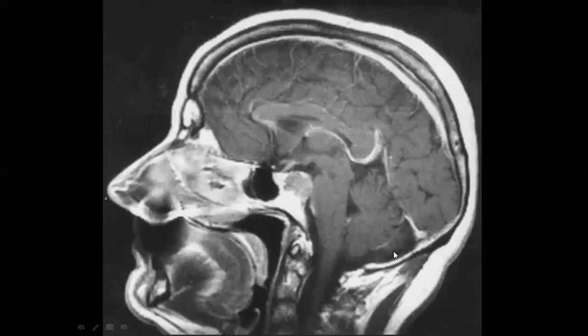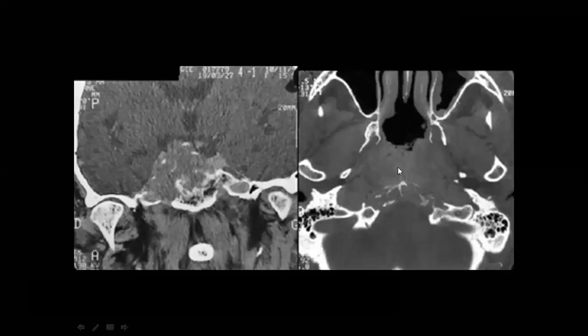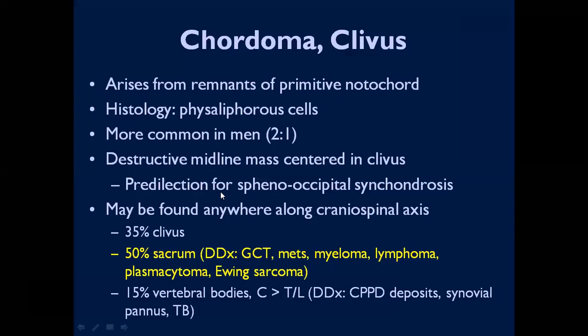So don't forget that when you find a midline lesion, put chordoma, but not just chordoma, you put a differential diagnosis, because it is like a tricky case. They put it there to hunt you. So don't rush, just say that the differential can be chordoma, metastasis, chondrosarcoma, especially if they have calcification. But at least think that it is a bony lesion. It comes in the bone. So when you think about it, you can reach the diagnosis. So chordoma in the clivus, I agree with you.